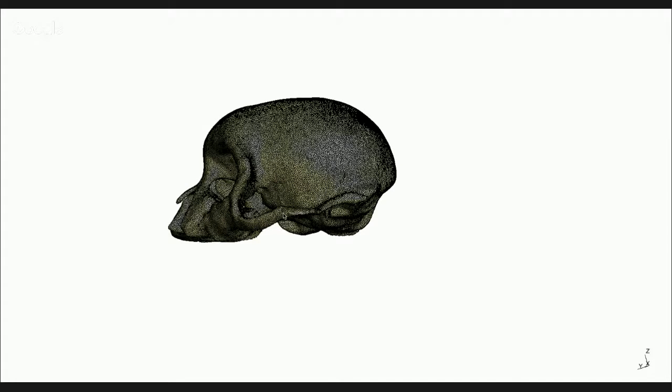Are there any questions from the audience or somewhere else? So your segmentation, this is a monkey, and I also noticed that in the human, the skull does not have anything for the lower part, right? Yeah, exactly. So if I have a segmentation with the skull in the lower part, will that also work in your software?